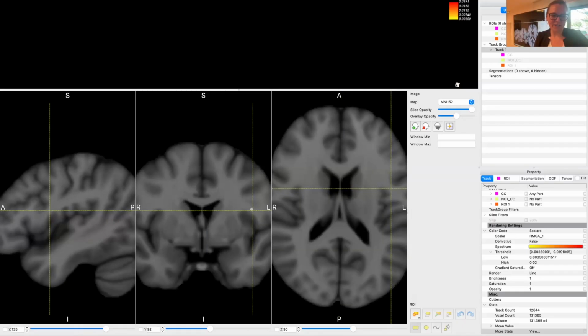So the way to orient yourself, the way I usually do it, is I zoom into this panel where you see this heart-shaped part of the inferior frontal gyrus. That is what we commonly consider Broca's area. And then here, what's this structure?